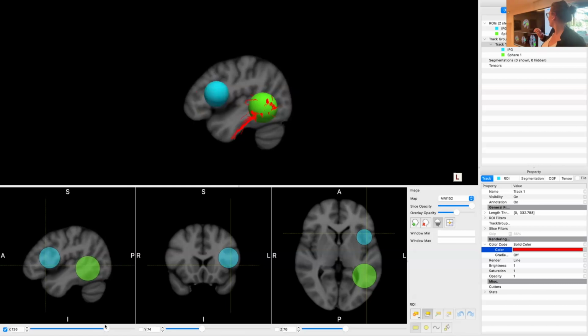And if I orient my brain in a way that I can see Heschl's gyrus again, at the end of the lateral fissure, what's the gyrus? Supramarginal, correct. At the end of the superior temporal sulcus, which gyrus do I have there? Angular. Together they are the inferior parietal lobe.